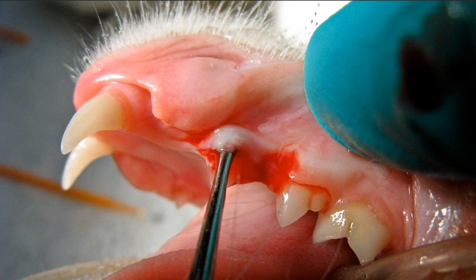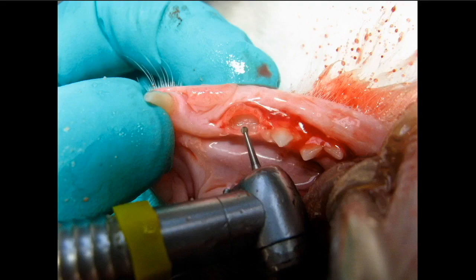And in order to resolve that, what we would do is go in there, open that tissue up, and take our little diamond football, diamond round burr, or, very carefully, a carbide round burr, and go in there and remove the crown down to where we have smooth bone, smooth all that out, extract that other tooth, and then close that, and that will take care of that problem for that individual patient.